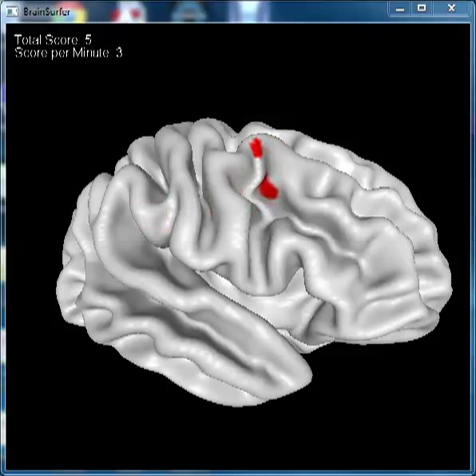This is the BrainSurfer software that was developed by Applied Neuroscience and runs inside of the software platform called NeuroGuide, which is an EEG software platform that acquires EEG from 45 different EEG amplifiers and then allows one to assess the functioning of the brain and to then also train the parts of the brain related to symptoms that are deviant from normal or are exhibiting periods of dysregulation.